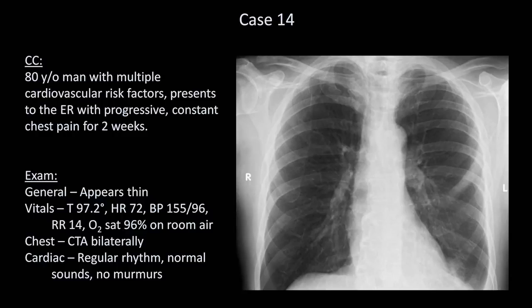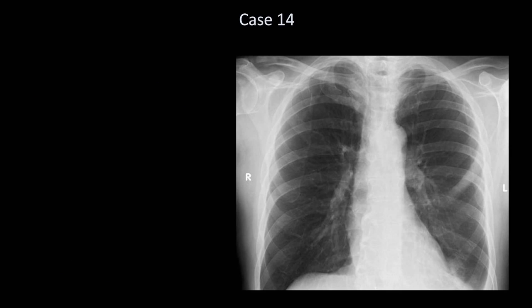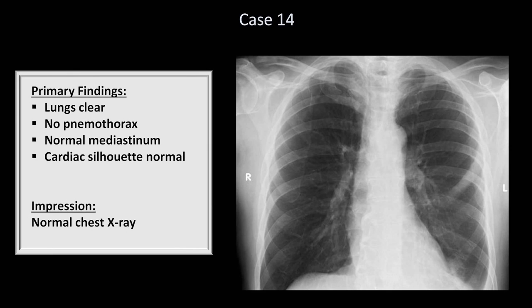When a patient with risk factors for acute coronary syndrome presents with chest pain, the X-ray is usually ordered to rule out so-called don't miss diagnoses. For example, to make sure the mediastinum isn't wide, suggesting an aortic dissection as the cause of pain, and to make sure there isn't a big pneumothorax or pneumomediastinum. Things like that. My guess is that 9 times out of 10, the ER doc or the internist who orders this chest film, in this context, would conclude that it's normal and then move on to admit the patient for a so-called rule-out MI admission.